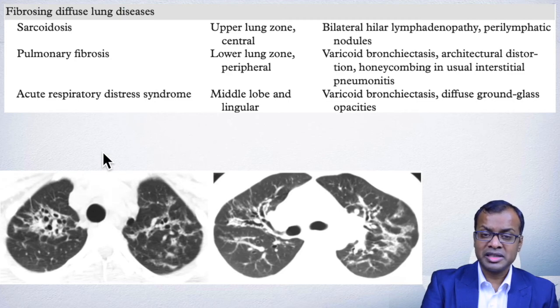Pulmonary fibrosis as part of interstitial lung disease will also give you bronchiectasis, but that would be of a traction bronchiectasis nature rather than a simple bronchiectasis. The last group we look at are post-recovery from ARDS, which can also lead to bronchiectasis.